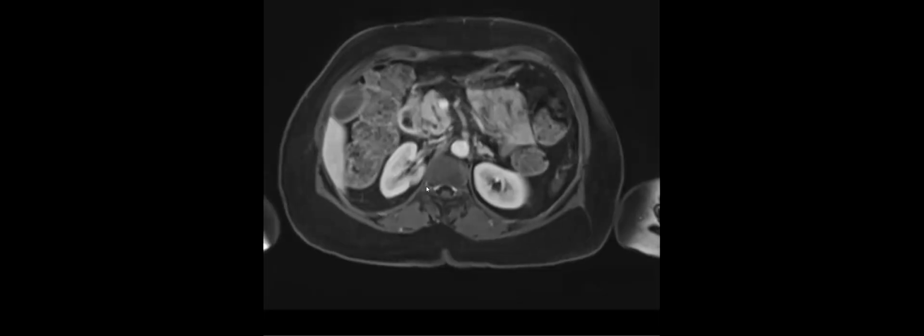Okay, now it's the scary part. Look at the liver. Oh, wow. Could not even see anything on non-contrast CT, and it's just full of liver mets. All these little ill-defined hypoenhancing lesions, nicely seen.